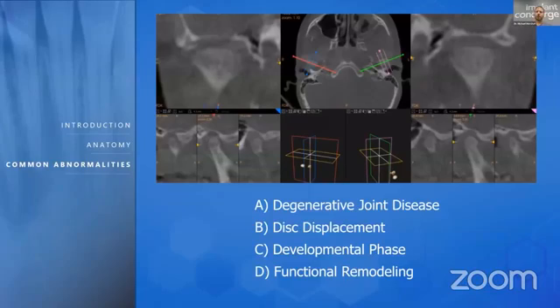Okay, what do people think this might be? It's a little bit of a trick question because I've got another slide that's going to help you make your differential diagnosis or diagnosis altogether. But notice the cortical outline, I keep on describing thin and continuous cortical outline. Here we don't really see the cortical outline. We don't see any subchondral cysts. We don't see osteophyte formation, but that cortical outline doesn't even appear.